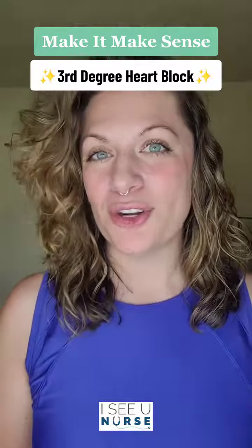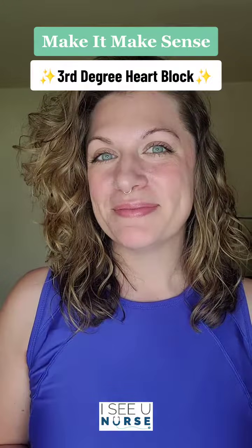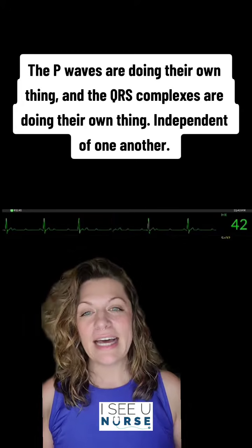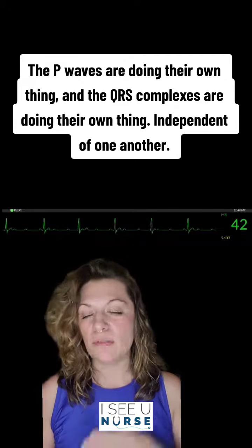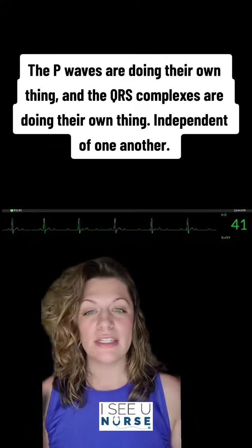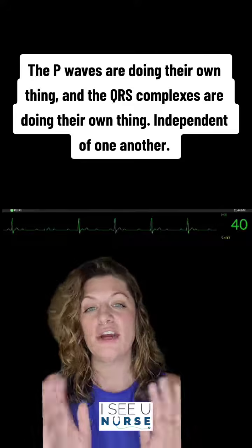Make it make sense. Third degree heart block. So this is an example of a third degree heart block. It has a classic sign of having the P waves march out consistently and the QRS complexes march out consistently, but they are not communicating together at all.